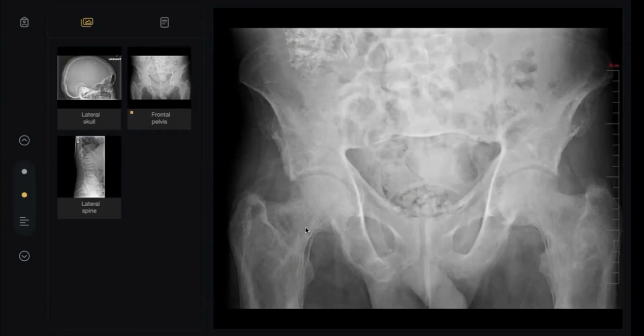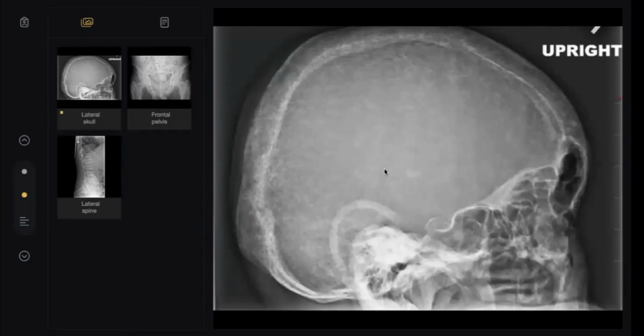Coarsening means that the trabeculae are just visible, because in normal bone you will not see the trabeculae like this. Why? Because of calcification, all the trabeculae are obscured. This is the normal. This is coarsening, but without expansion or cortical thickening. So there are no signs of Paget disease. And this, my colleague, is a salt and pepper appearance. This is not a cotton wool appearance at all.